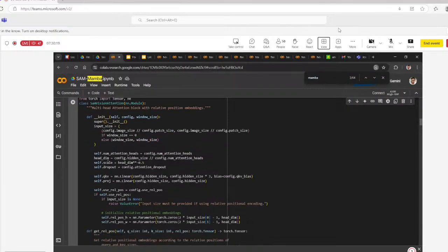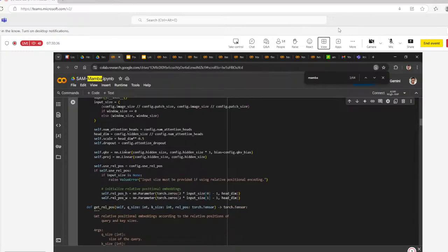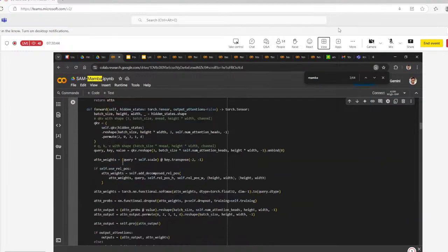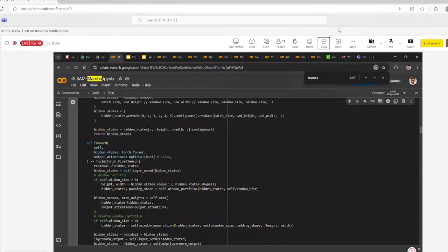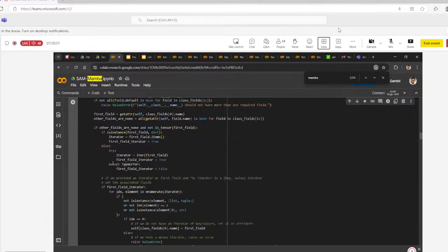The attention modules are a more matured implementation. This code repository was developed by the first author. We have taken it and we're trying to understand what he has done. This is the self-attention part, the SAM vision layer. There is a custom network somewhere.